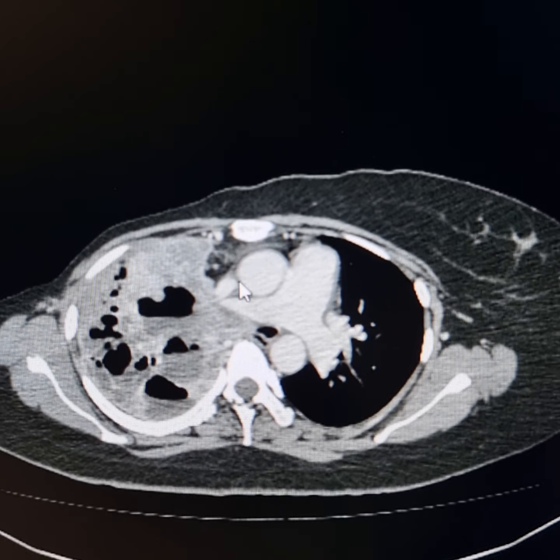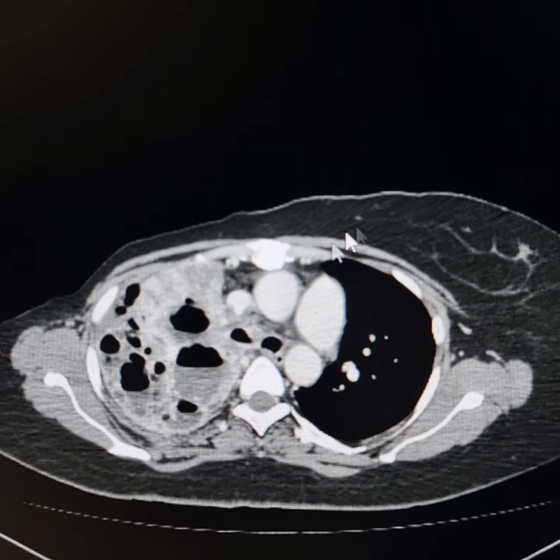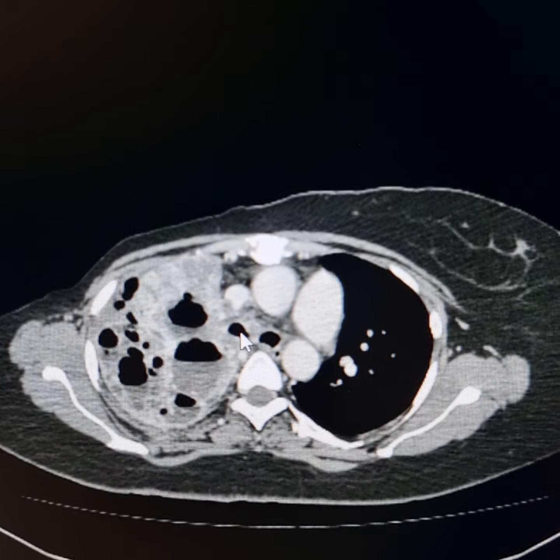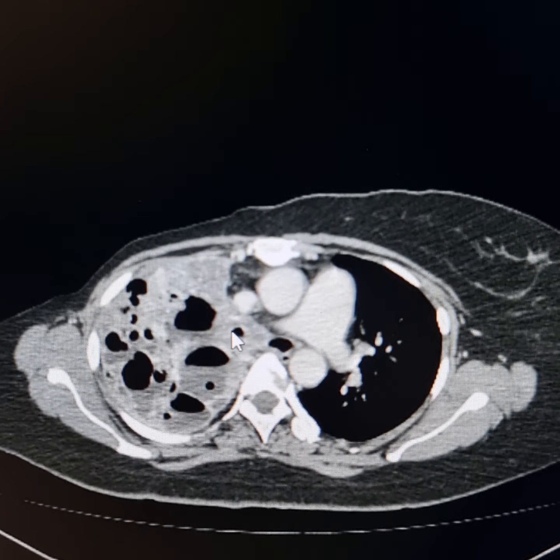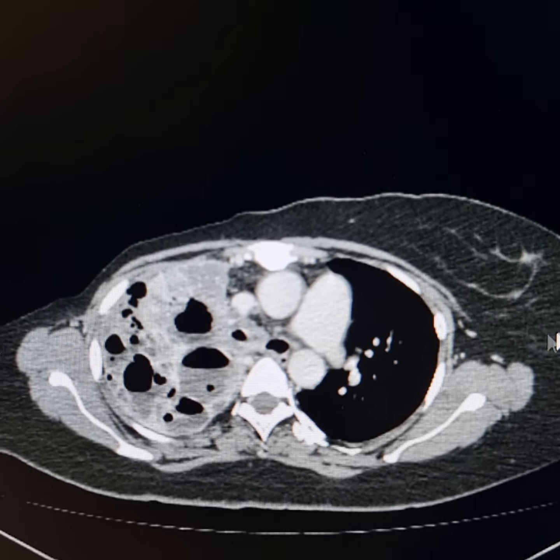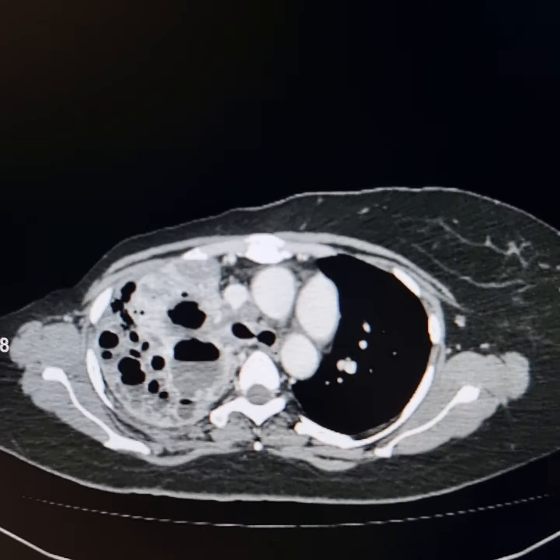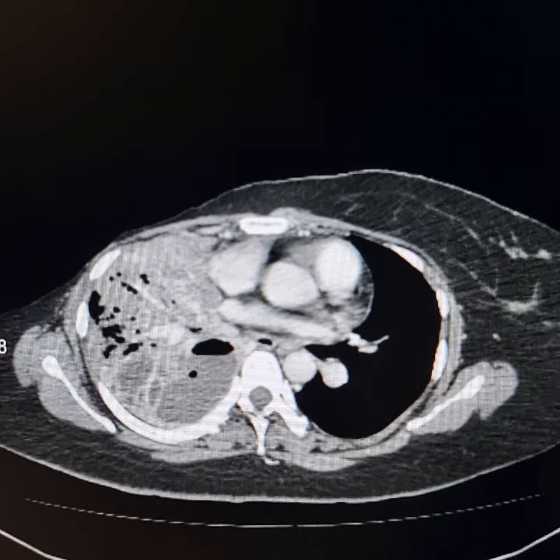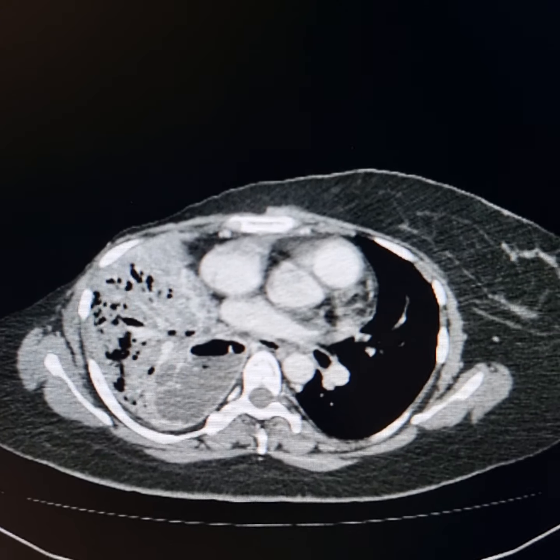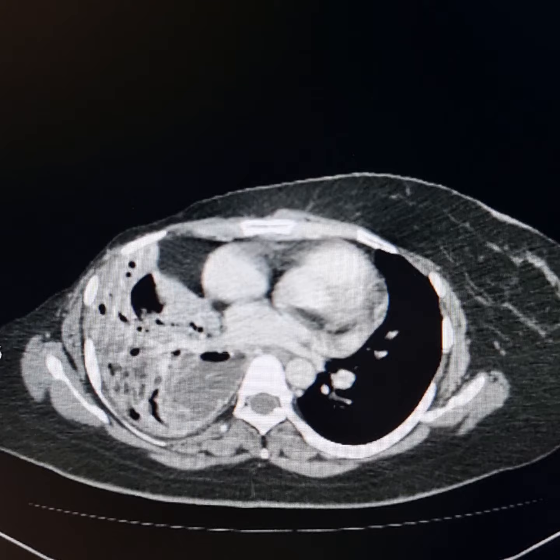You find this mass here, this one. Now this has occluded the right main bronchus. Just observe the occlusion of the right main bronchus. This has resulted in consolidation of the whole of the right lung. Multiple cavities are noted in it. Dilated bronchi are present inside it. Necrotic areas and air-fluid levels are seen in the cavities.